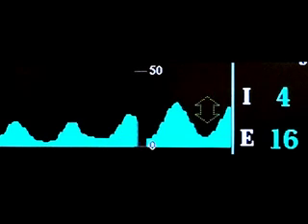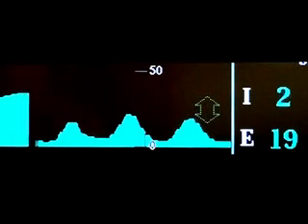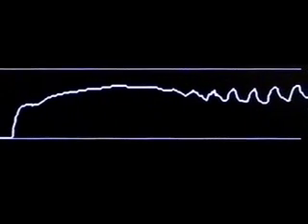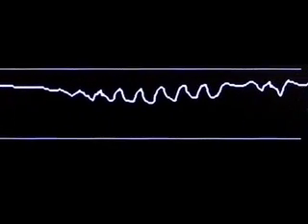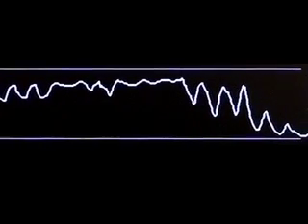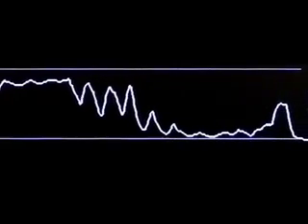Shallow breathing transiently lowers EtCO2 because of dead space ventilation, but EtCO2 rises again when full gas exchange occurs. Cardiac oscillations result from the transmission of cardiac movements to the lungs and airways. These oscillations are usually seen when either respiration is slow or the tidal volume is small. Such oscillations suggest inadequate ventilation, and a capnogram with prominent cardiac oscillations suggests the need to initiate assisted or mechanical ventilation.